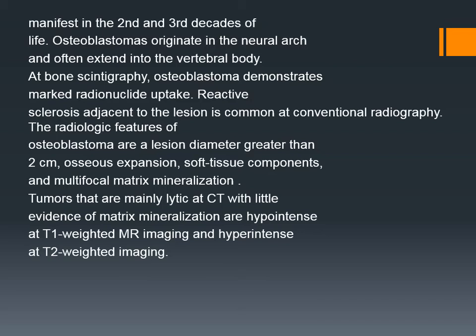Aggressive osteoblastoma is just a big, aggressive osteoblastoma. Enlarged size, the same radiologic features except for larger size and local aggressiveness. It can have soft tissue extension.